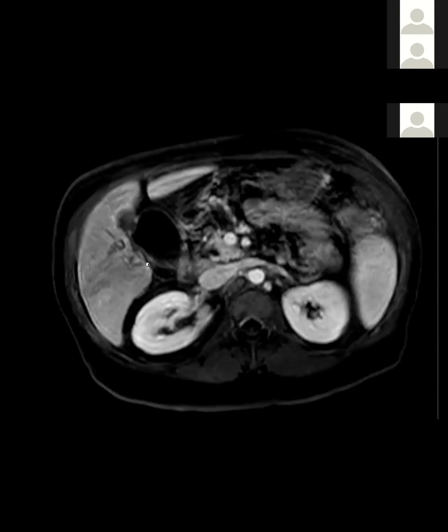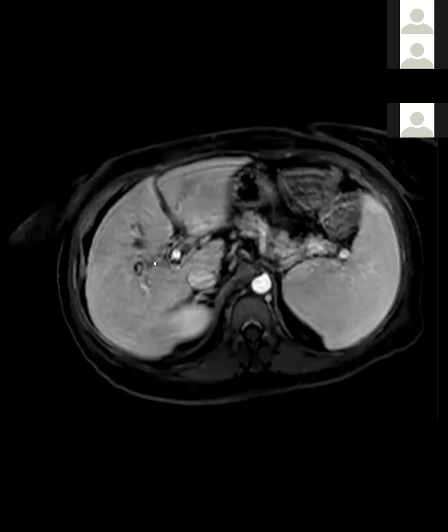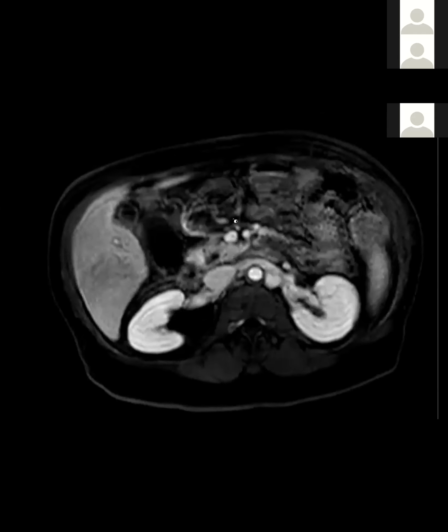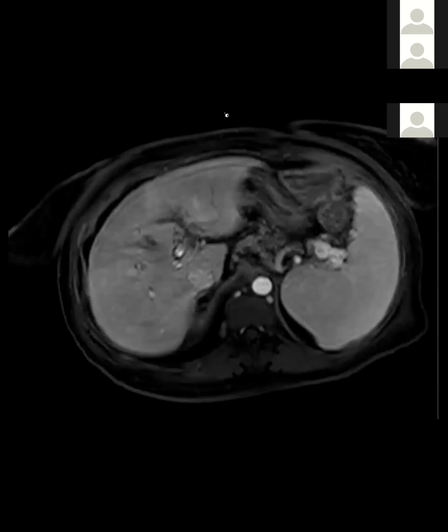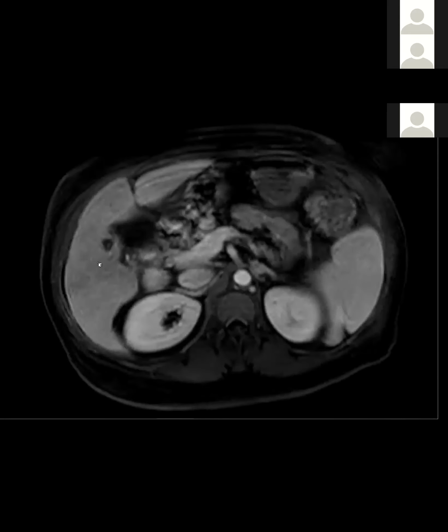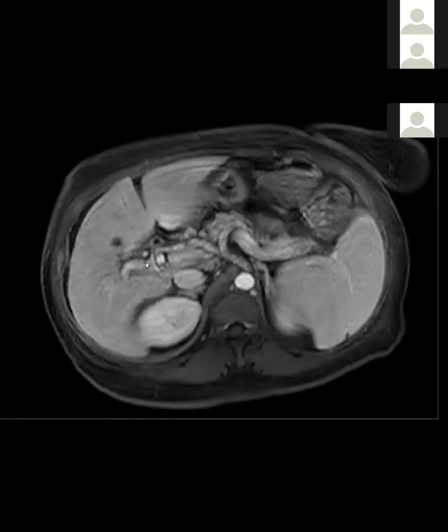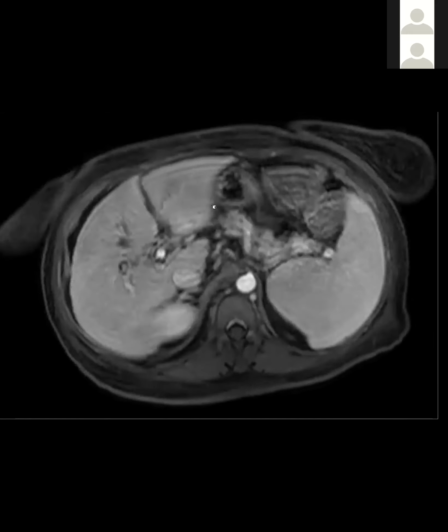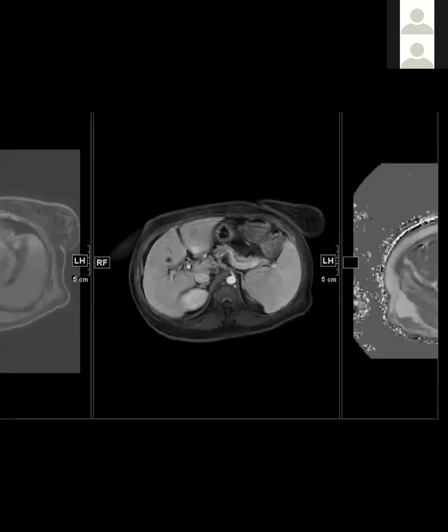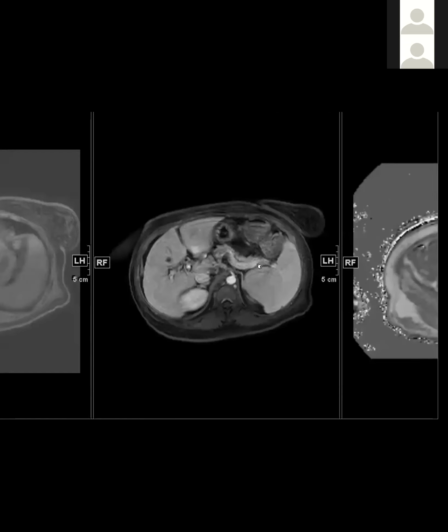An acute thrombus? I'm thinking less of a tumor thrombus and more of a regular thrombus. This is just an example that acute thrombus can restrict. Even though this patient has significant restricted diffusion in the thrombus, we should not call this tumor in vein. Because there was high signal intensity on T1, you can always confirm lack of enhancement on the subtraction images.